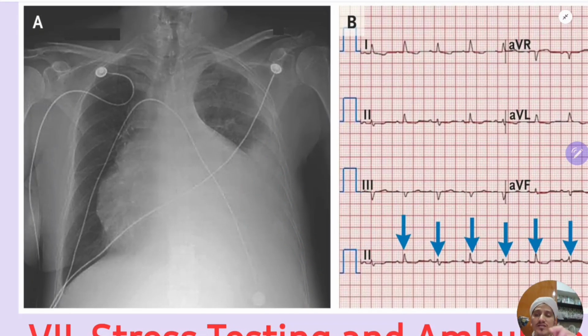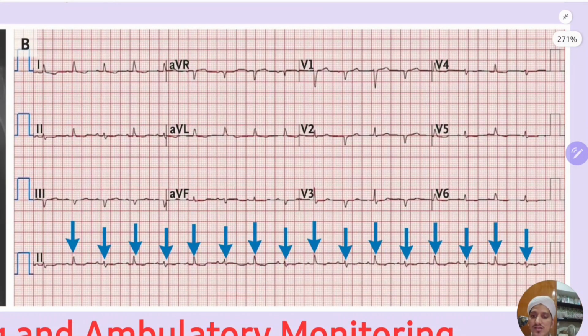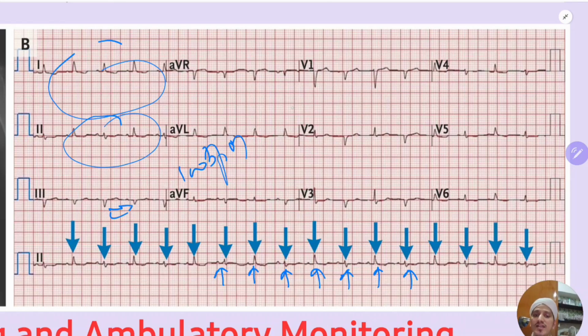The cardiomegaly can be due to dilated cardiomyopathy or some other cardiomyopathy, or it can be due to pericardial effusion. So an ECG is taken from this person. So what you are seeing is the triad, you are seeing electrical alternans. So that means there is massive pericardial effusion in this patient, and I think that effusion is because of heart failure, early heart failure, pulmonary edema with effusion. You are seeing it left-sided. Okay, cardiogenic pulmonary edema, that is. And if you calculate the heart rate, it is approximately 100 beats per minute. And you can see generalized dampening of the QRS complexes. Okay.